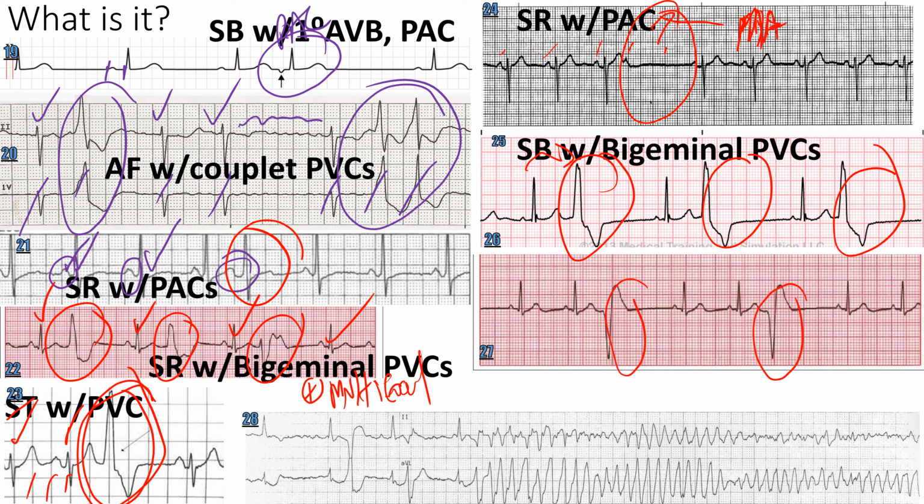All right, this guy. PVCs look good. It's happening every 1, 2, 3 beats. So that has a pattern to it. So it's what's called bigeminy, trigeminy, quadrigeminy. That is trigeminy. How do I know that's not a PAC? Well, there's no P wave, but also it's wide. It's wider than the underlying rhythm. Okay, so it's sinus, not too fast. 300, 150, 100. So it's between 60 and 100. Sinus rhythm with PVCs. What kind of PVCs? Trigeminal PVCs.